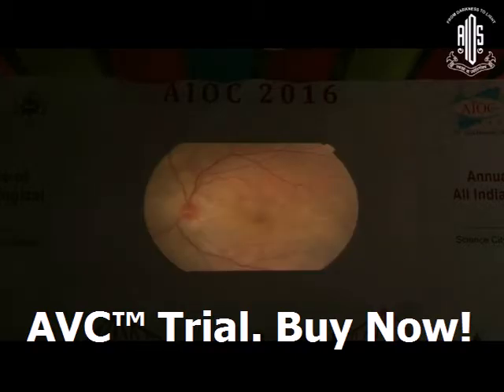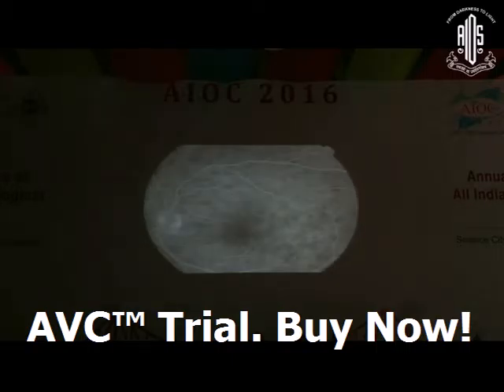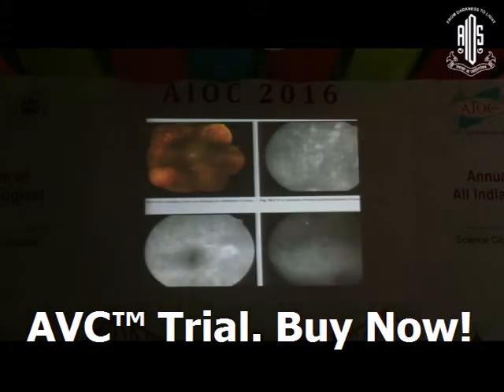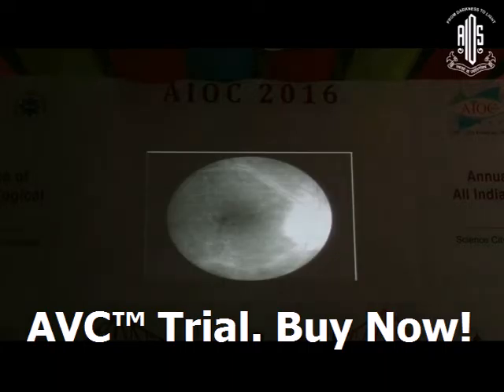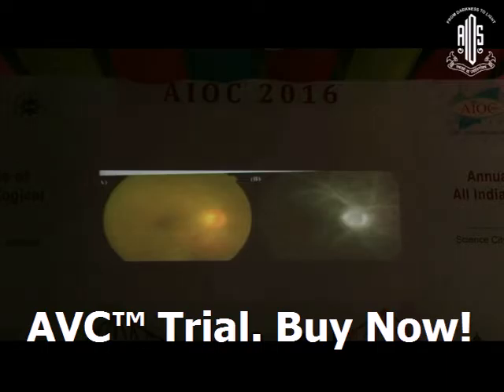Okay. So these are the APMPPE fundus angiograms, initially hypofluorescent, becoming hyperfluorescent. Birdshot retinochoroidopathy, clinical picture, multiple spots seen on the angiogram also. Syphilis also can have various presentations, but the commonest is vasculitis as seen in this picture, and the leopard skin appearance, very characteristic. Optic atrophy and vasculitis and vitreous in syphilis.